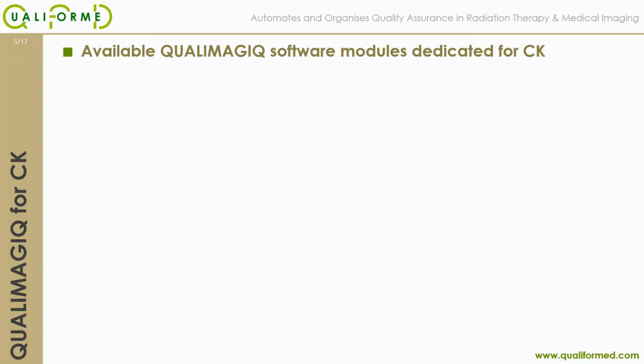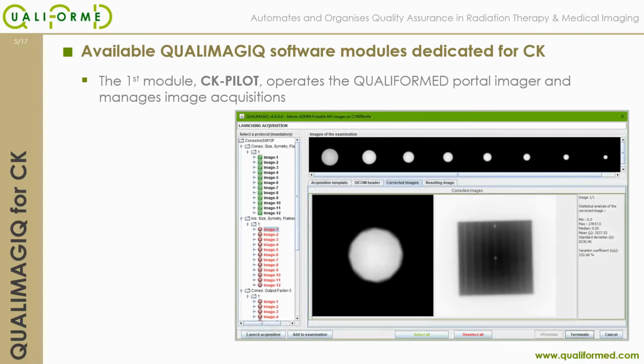We will be taking a close look at QUALIMAGIQ used in the framework of CYBERKNIFE quality control. A video devoted entirely to the QUALIMAGIQ platform is available if you would like an in-depth look at the platform. The first QUALIMAGIQ module designed for CYBERKNIFE treatment machines is CK Pilot. Its purpose is to pilot the image acquisition with our portable portal imager.